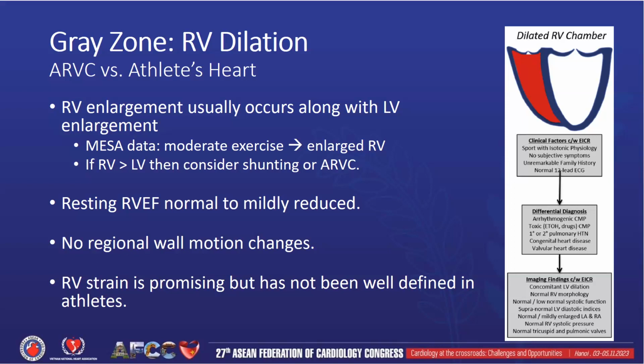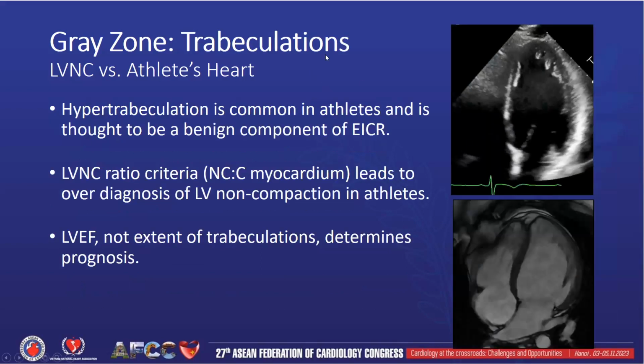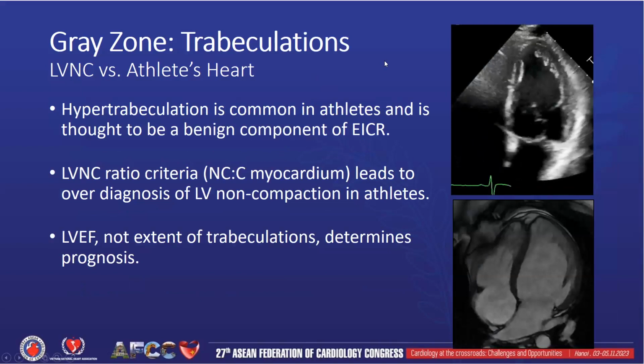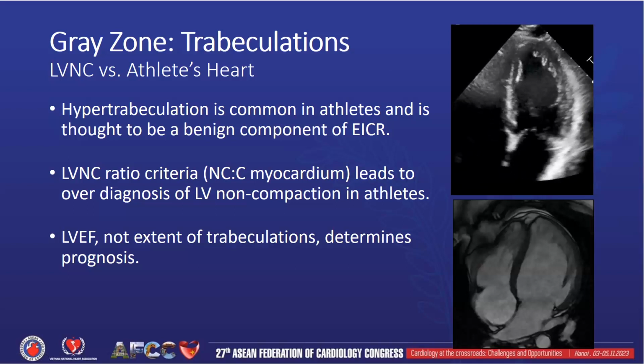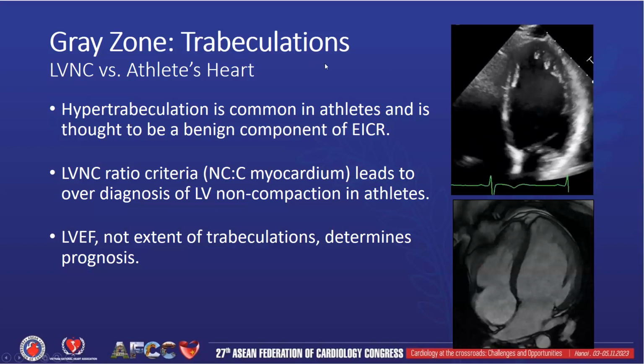And we started to use RV strain in our laboratory, but it has not been well defined in athletes to date. The last sort of gray zone conundrum that can arise is that between left ventricular non-compaction and athlete's heart.